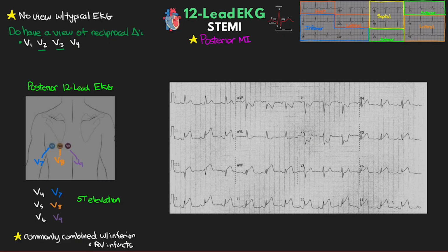So as an example of just this, here's an EKG with high suspicion for a posterior wall MI. You'll note the deep ST depression in V2 as well as depression in V1. It looks like some in V3 as well. Along with that, we also see ST elevation in leads 2, 3, and AVF, with some reciprocal depression in AVL, indicating inferior wall MI, as well as some lateral involvement with elevation in V6, and looks like some in V5 as well. But given the anterior ST depression, especially the magnitude of it in V2, we would definitely want to get a posterior view to check for posterior wall involvement.